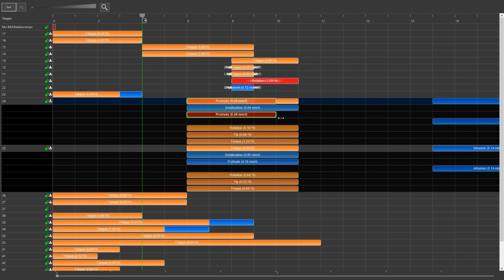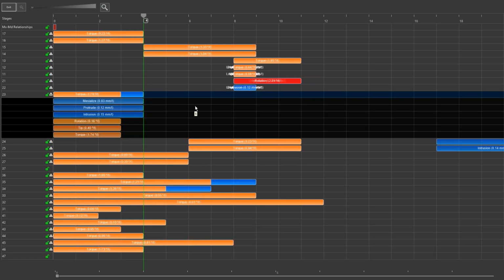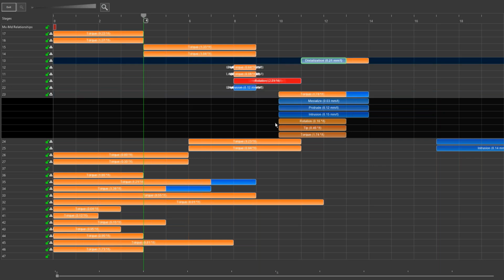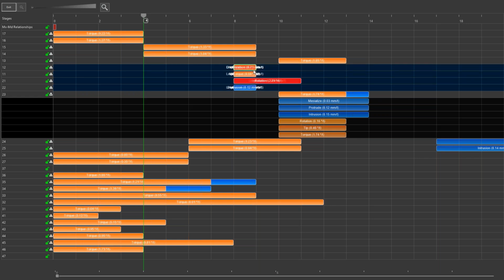If I go past the permitted movements, it's going to turn red. So that's my cue to know what's happening. I'm going to get rid right here of the canine, which would be more or less like here. And if I want symmetry, then I can start doing my canines at the same time. These are my incisors.